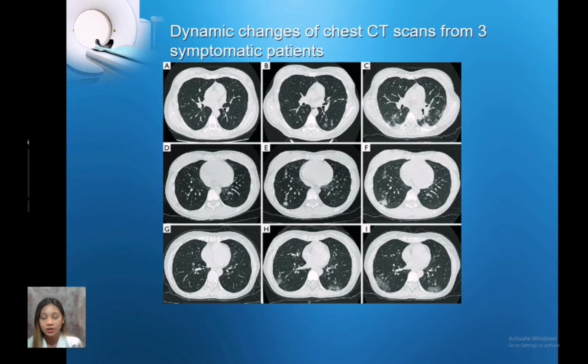They underwent another CT scan, 3 days after the previous scan, which is letter H. In the CT scan again, the appearance was pneumonia. So you can see that the ground glass opacities in this patient are bigger. By this, it can be confirmed that the patient has a particular disease. So these cases are different, but you notice that they all show ground glass opacity in the lungs. You can differentiate a patient from normal if they have a particular disease.